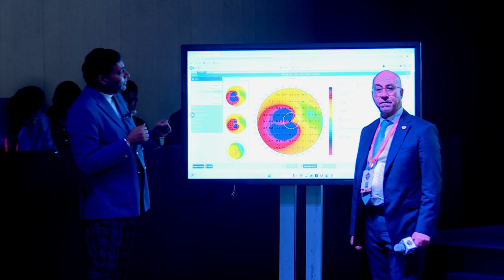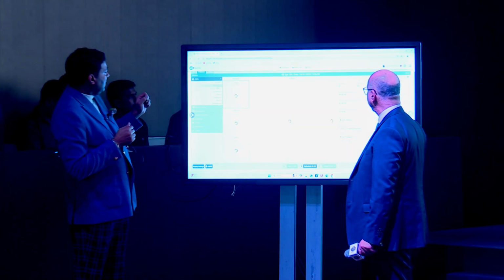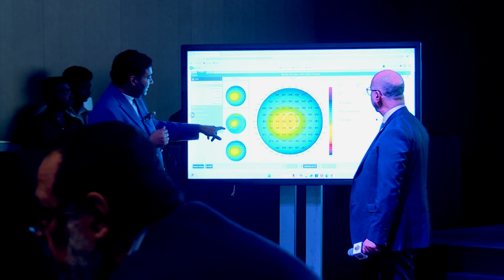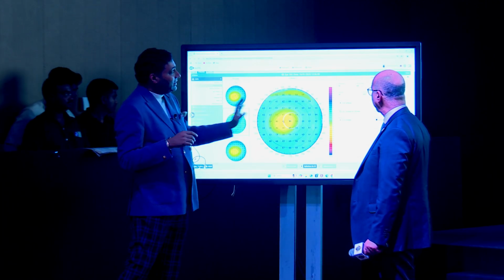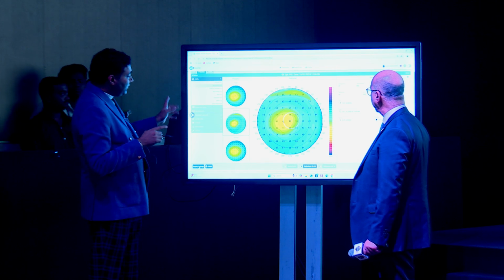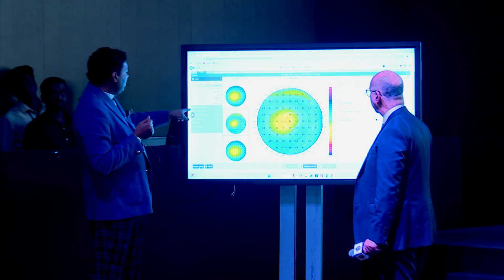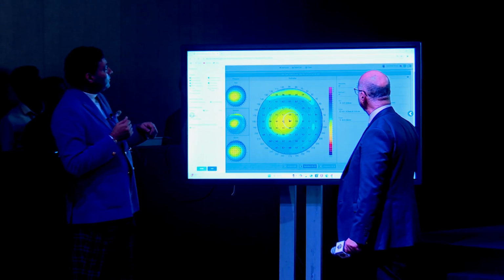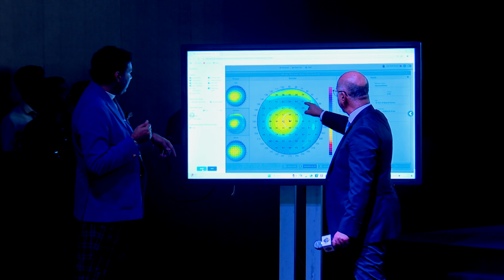But what I like about it is, you go to the pachymetry, and there is your epithelial thickness. This is very important because it shows you how the epithelial thickness is. But the machine also has an internal repeatability function. If you go to the repeatability, repeatability, ray tracing, yes.